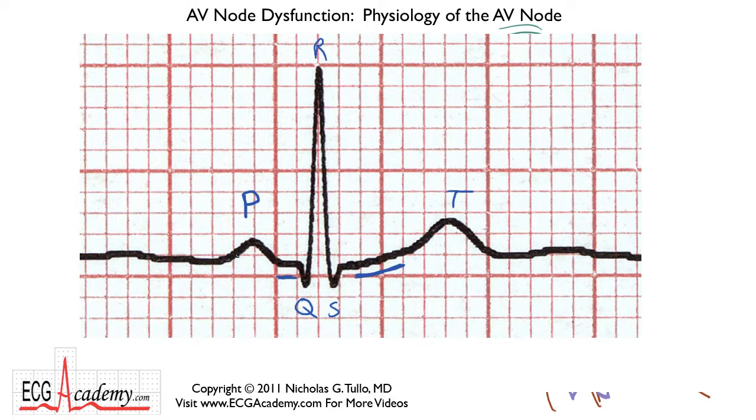Where does the P wave start? It starts where the P wave just leaves the baseline. Where's the baseline? Well, that's the segment that's in between the previous T wave and this P. Now you can see in this ECG the baseline does drift a little bit, but you can get a sense that right about here is where the P wave begins. And right about here is where the QRS complex starts. Now with some practice you can eyeball these PR intervals, but the best way to do it at this stage of the game is to use a pair of calipers.